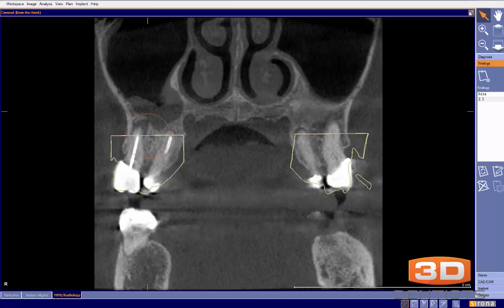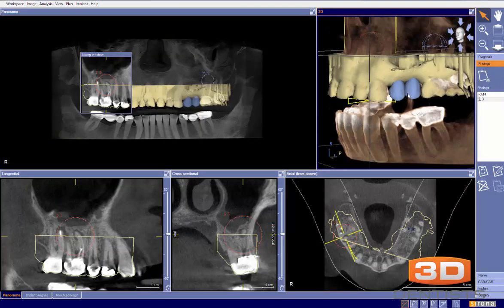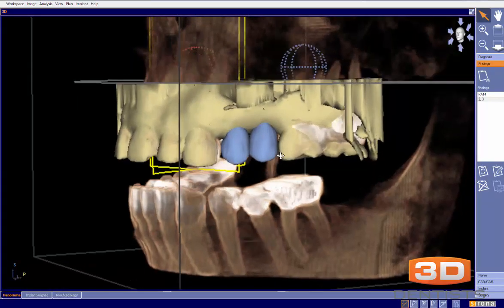So on to number 12 and 13, what we were taking a closer look at. The good news is we can get CEREC data in. So this is going to be a digital guide, either an Opti guide, a Digi guide, or two CEREC guides if you want to do in-house milling. A couple of critiques I have in terms of the CEREC design themselves.